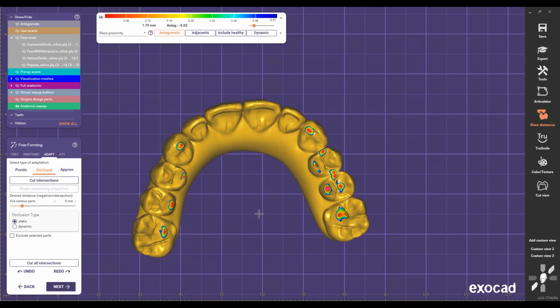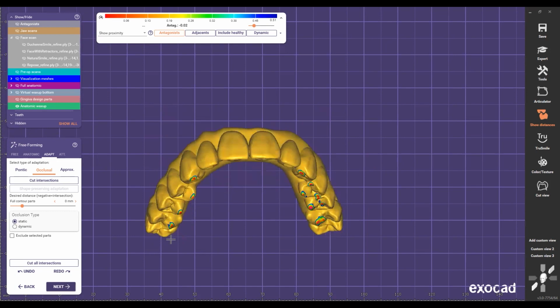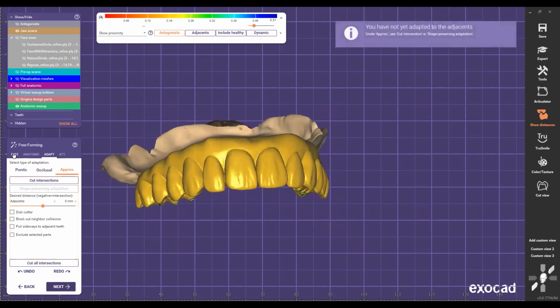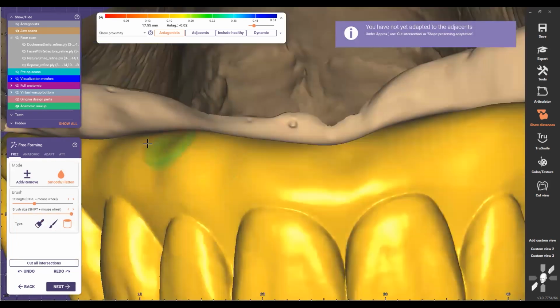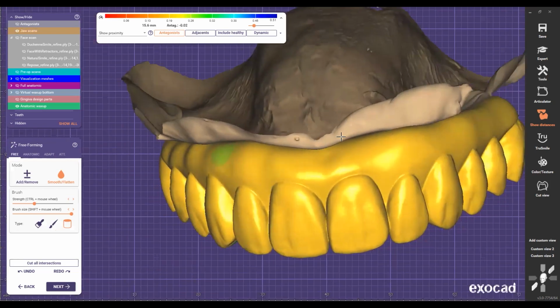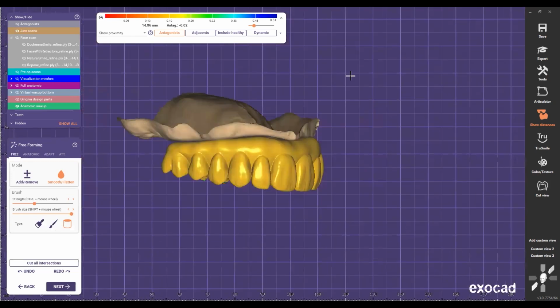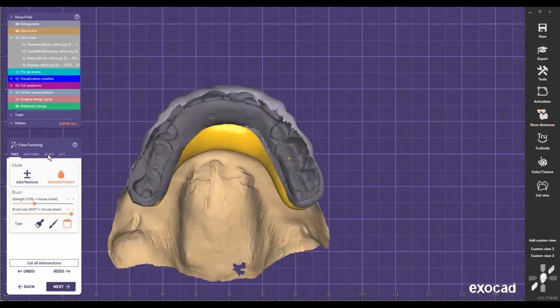Okay. Our goal is to save the dentist a lot of time, so that they don't have to be grinding this. So let's say I'm happy with everything. I'm just gonna make this look better there. Something like this, right? Because I was changing things there, pulling things. So once I know this, the contact points are just pretty much right there. Let me see if I adjusted them.